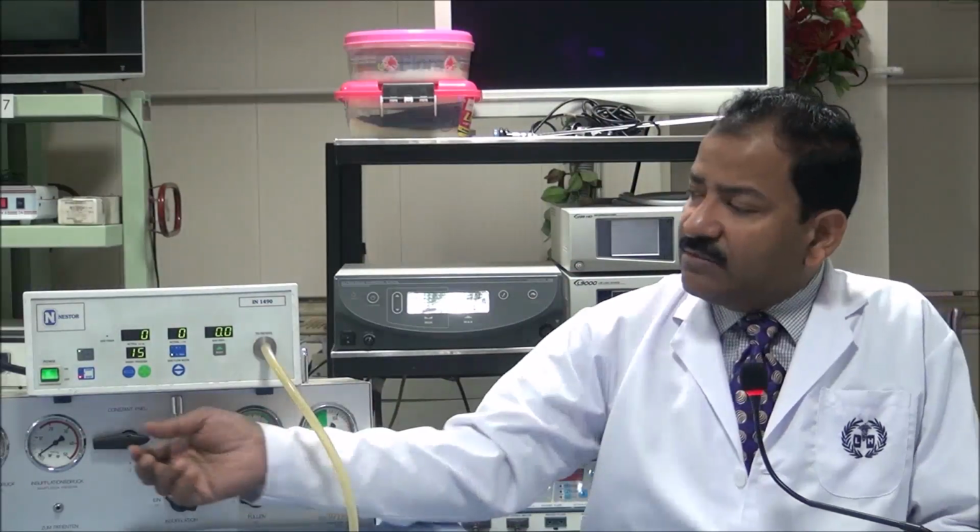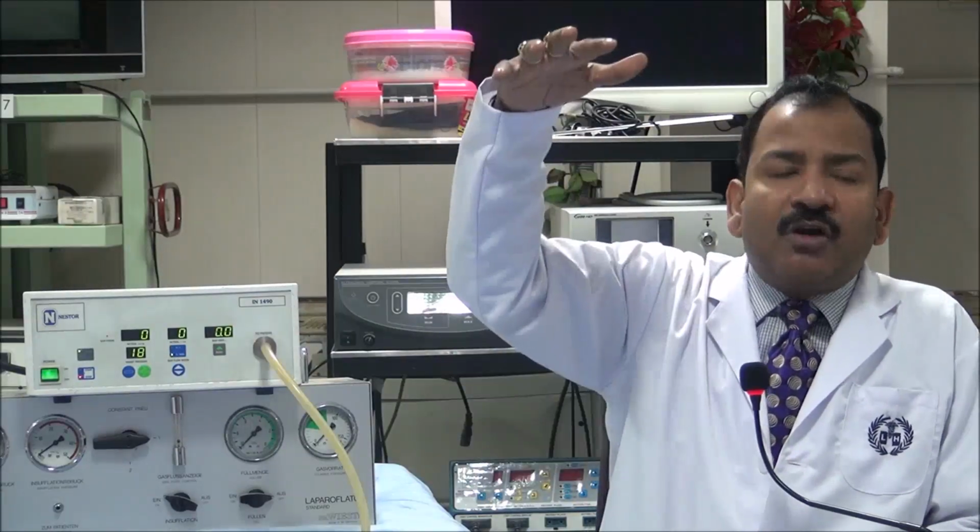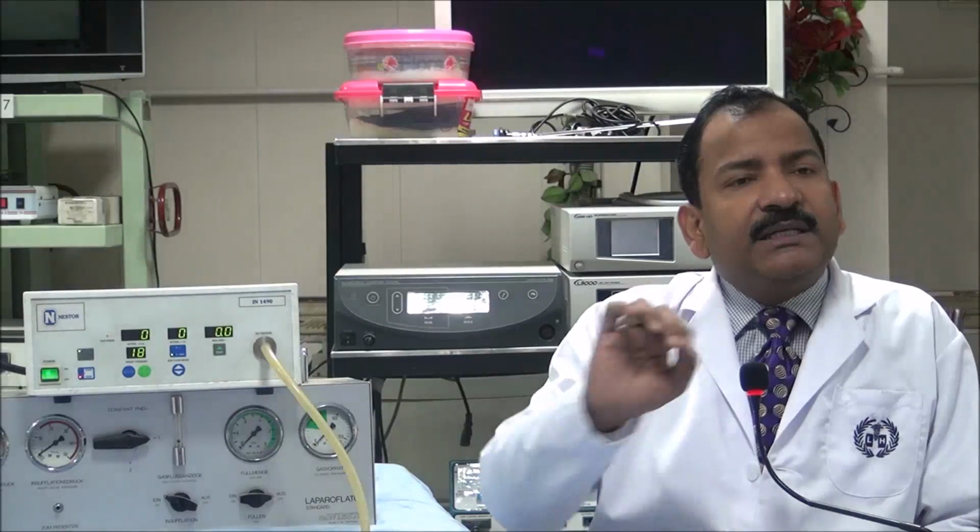In those situations, sometimes you may increase up to 18. But 18 is your last reading. After 18, if you go, all the problems will be quadrupled. Even in the bariatric patient, if you go after 18, the abdominal wall has so much fat that the abdominal wall could not be lifted up. The vena cava will be pressed more, and the patient has all the problems quadrupled.